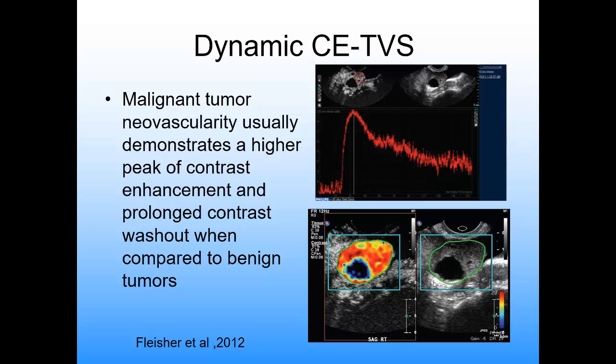This is an apparently normal ovary, but it shows marked enhancement on post-contrast. So this is an early malignant process in this ovary. And this is very important in the early detection of ovarian neoplastic lesions.